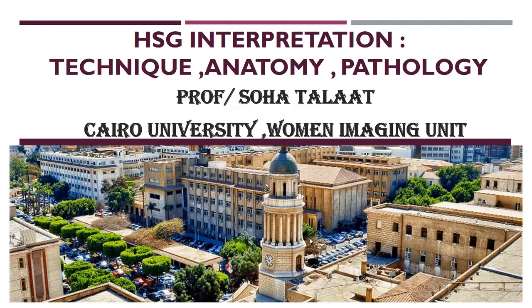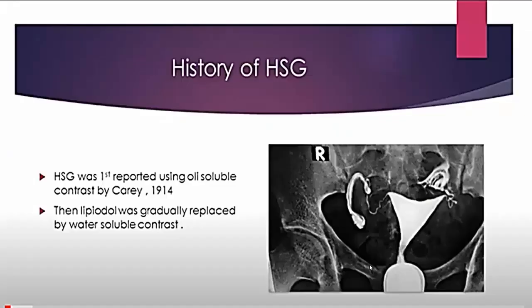Hysterosalpingography interpretation technique, anatomy and pathology. Hysterosalpingography was first reported using oil-soluble contrast by Carey in 1914. Then lipiodol was gradually replaced by water-soluble contrast media. This is the oil contrast. It is more dense. You can see here the fallopian tubes. We will see the anatomy later on.